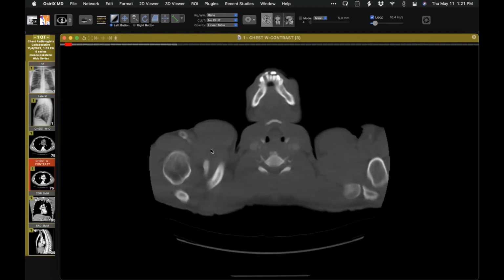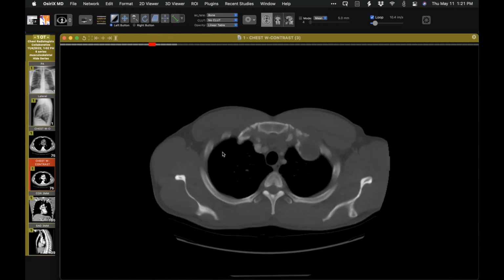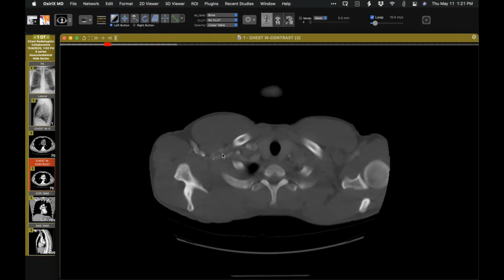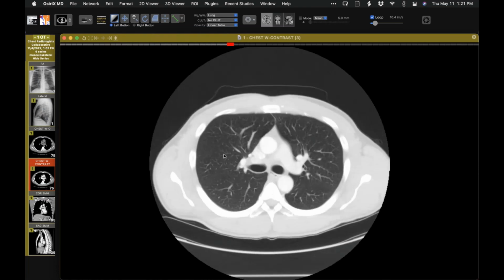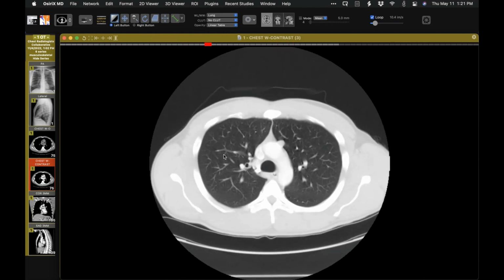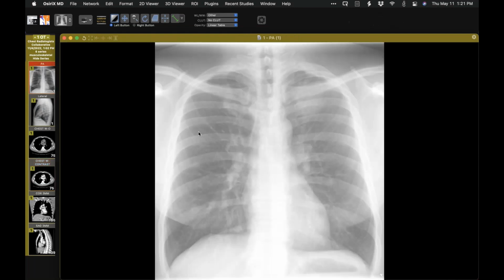And no surprise that we have this lesion right there that explains why it looks the way it does and its relationship with the first rib and the costal cartilage. And yeah, this is the way this patient presented with metastatic chondrosarcoma. So nice teaching findings for an opacity like that for a non-pulmonary lesion, suggestive of a chest wall lesion.